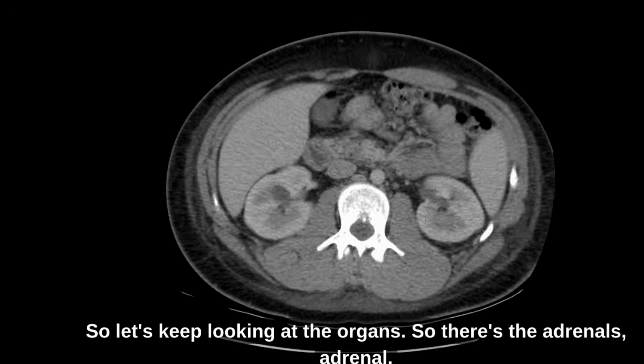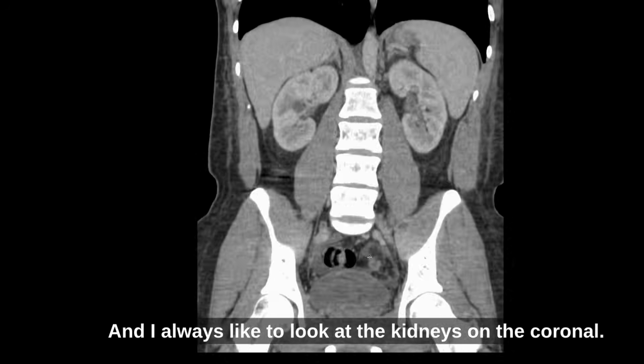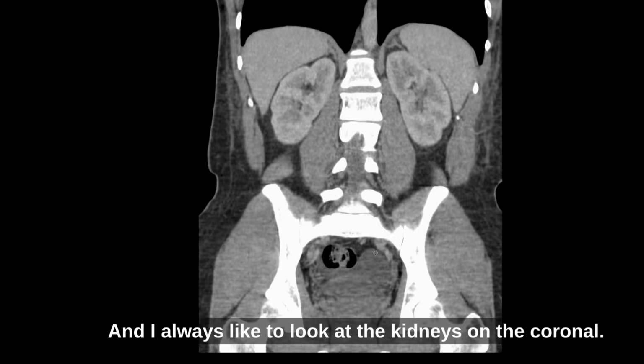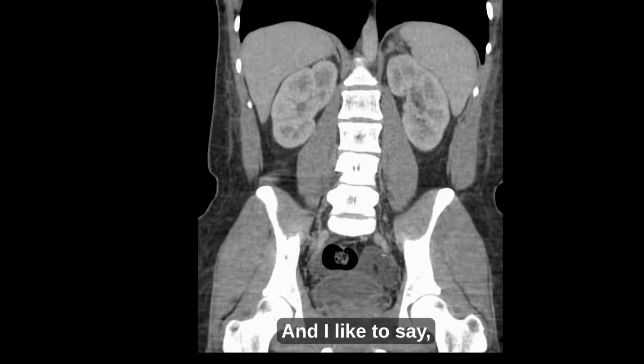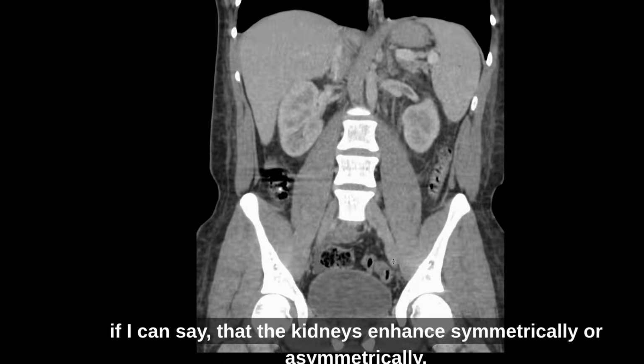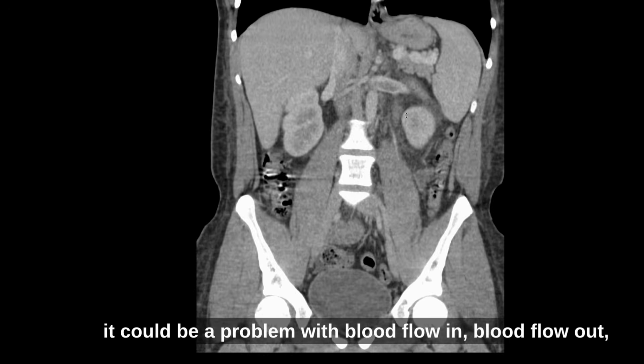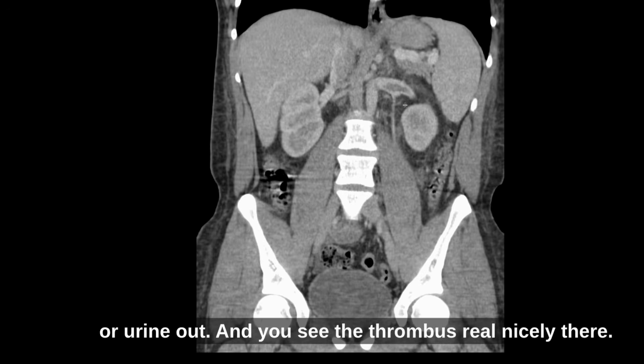So there's the adrenals, adrenal, and then we'll have our kidneys. And I always like to look at the kidneys on the coronal. And I like to say, if I can say, that the kidneys enhance symmetrically or asymmetrically. And if they're enhancing asymmetrically, it could be a problem with blood flow in, blood flow out, or urine out.